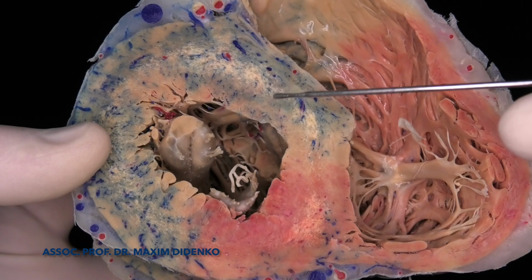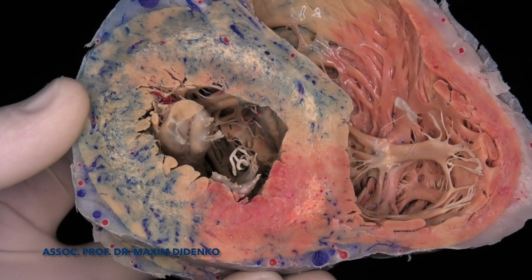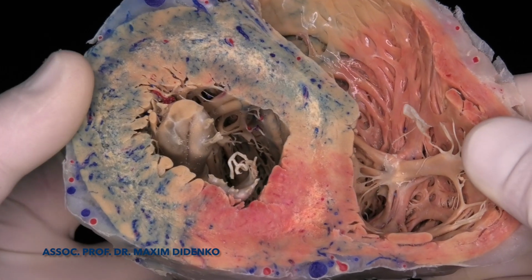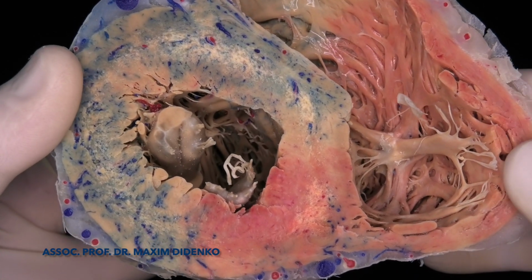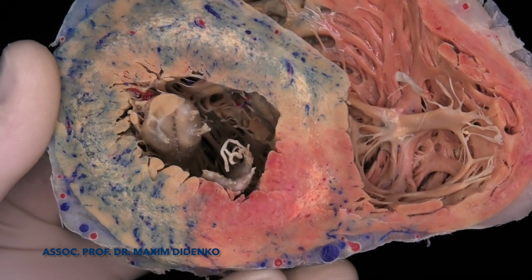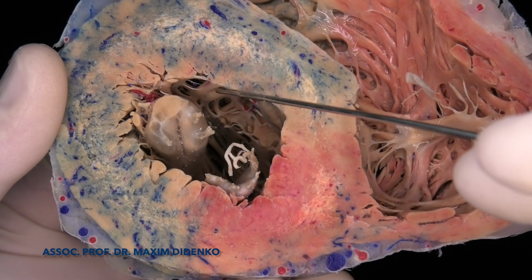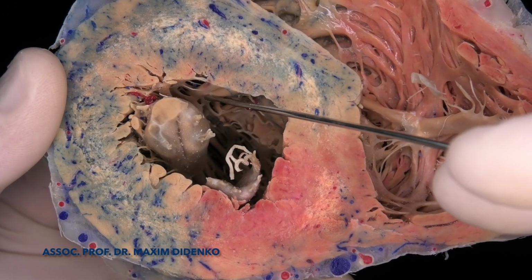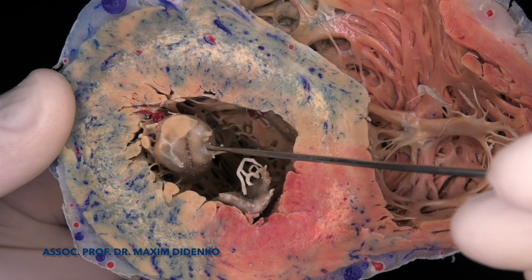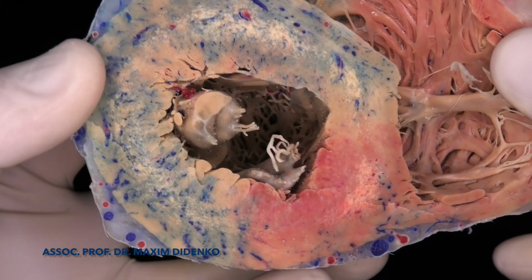If we would like to better understand the direction of the conduction system and of fascicles, again we just have to imagine that the conduction system activates first the papillary muscles. We can see this is the anterior direction of the anterior fascicle or superior fascicle towards the anterior lateral papillary muscle.